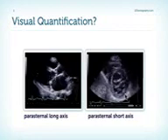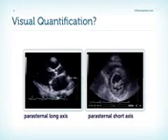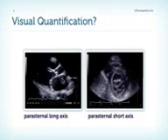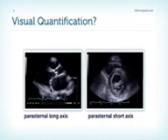Here in the short axis view, we get a very good impression of the opening motion of the valve and how large the orifice actually is. However, again, here we do not know exactly where the valve was cut. Was it really cut here where it is smallest, or further towards the left atrium?